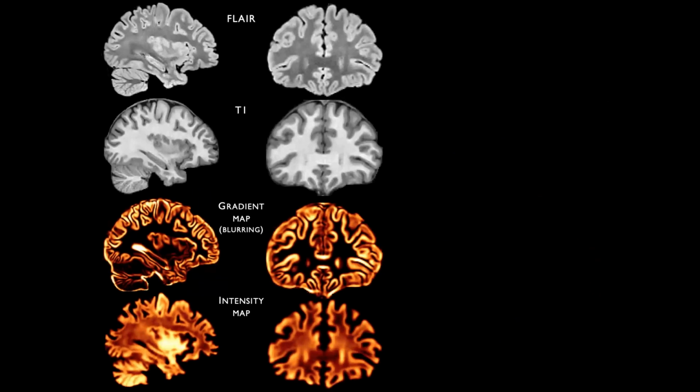Now moving on to another case of so-called MRI negative epilepsy, who had an episode of status epilepticus with hypermotor features. When looking at the texture maps, we saw a subtle blurring with local signal breakdown on the gradient map and a signal intensity on the relative intensity map in the orbitofrontal region. This was very small, measuring 6 millimeters in diameter and with a volume of 260 cubic millimeters.